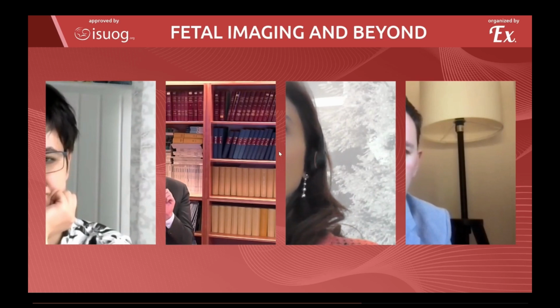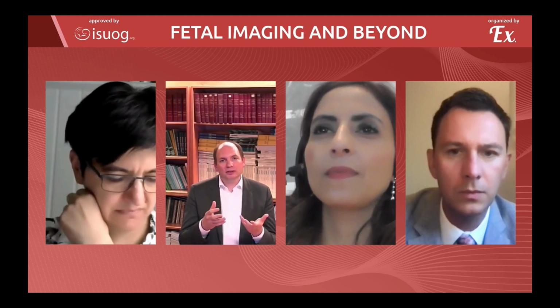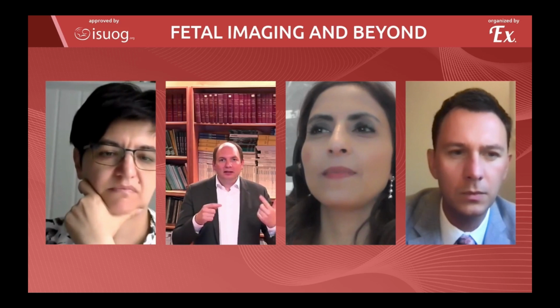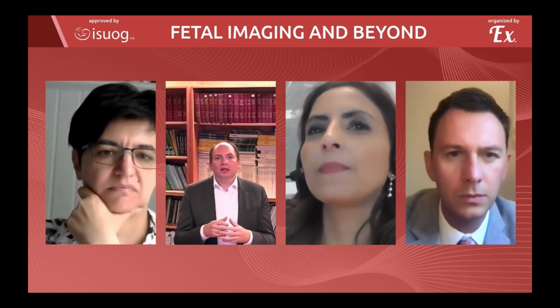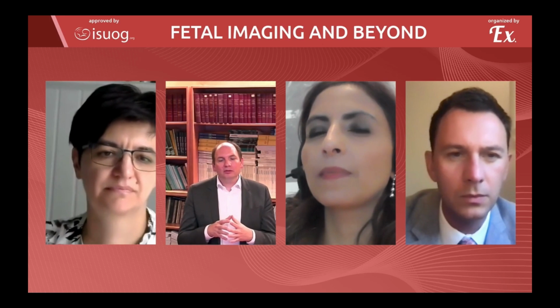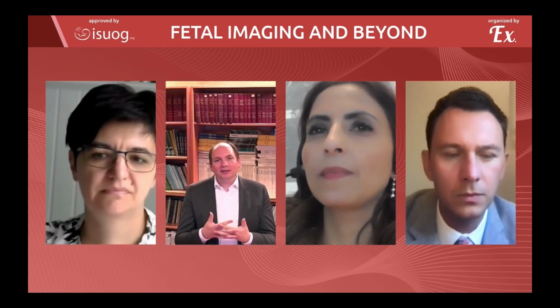And those are the cases which are secondary to brain injury or hemorrhages. So there are forms of callosal damage secondary to hemorrhage or ischemia. That's something, there is a connection. But for the true, typical type of callosal agenesis, it really depends. The answer is, it depends where you're practicing.